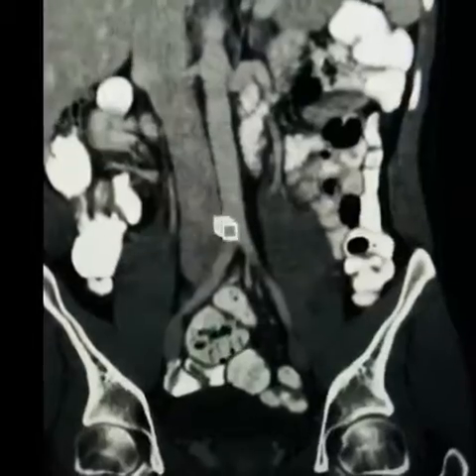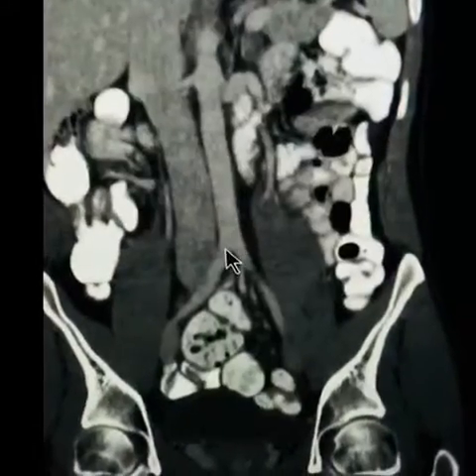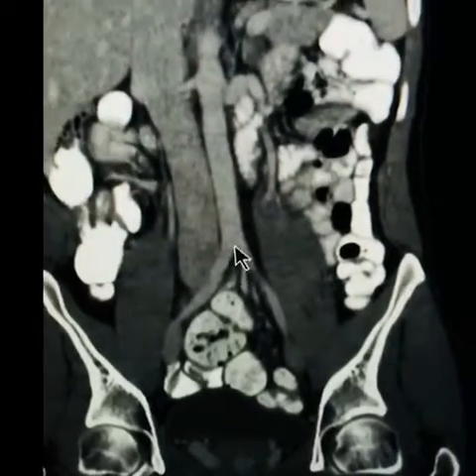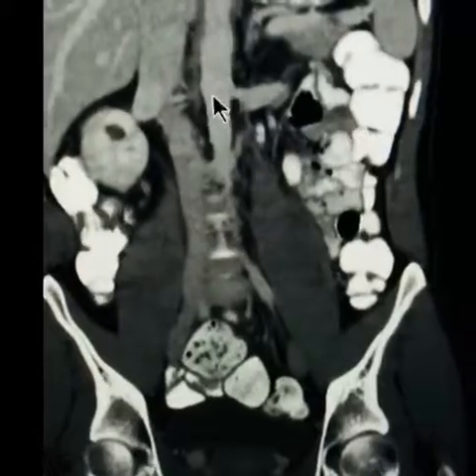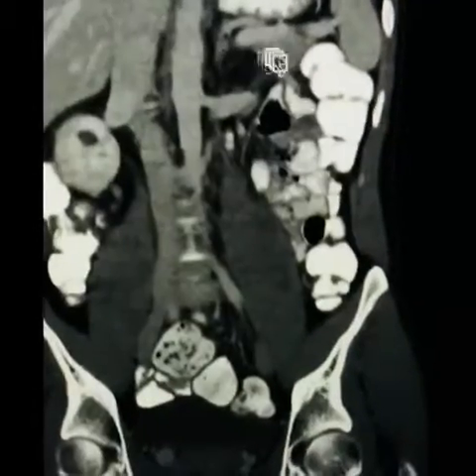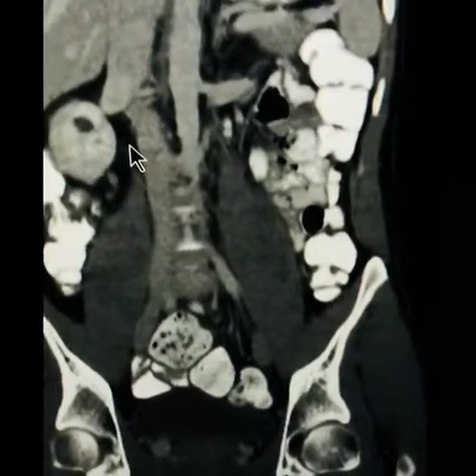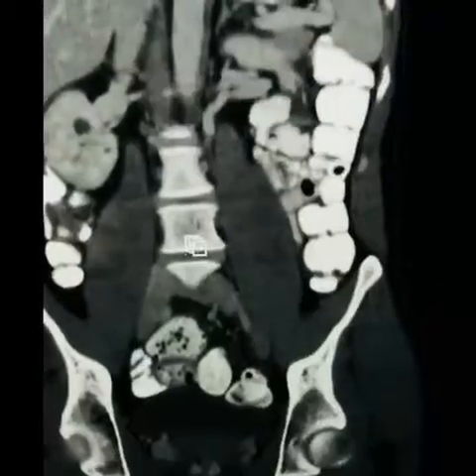And you can watch how this aorta actually extends from up here all the way down to here, and then it branches off into these two common iliac vessels, and basically off of this aorta are offshoots of vessels that feed the kidneys, they feed the spleen, they feed the colon. It's really quite amazing. It's like a tree with branches.